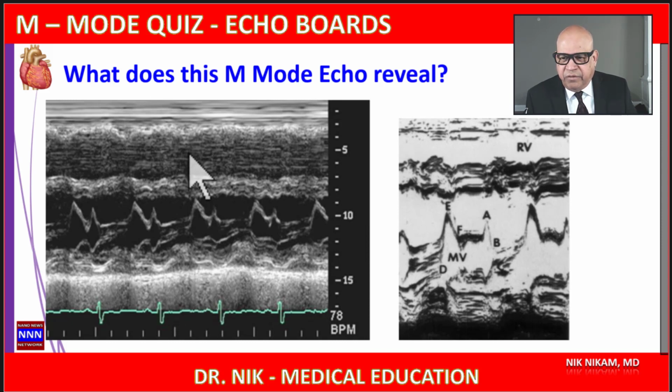What I would like to point out in this particular M-mode is that, like the previous one, we saw an M-mode going through the mitral valve leaflet level. That's very important to understand, at what level these recordings are done. That tells a lot about what we are looking at and how to use that information in coming up with a diagnosis. So this is at the mitral level, and we see the diamond-shaped opening of the mitral leaflets, both the anterior and the posterior leaflets, and here are certain designations given to the mitral valve opening.